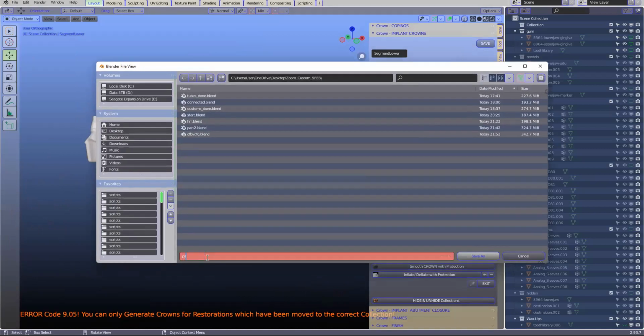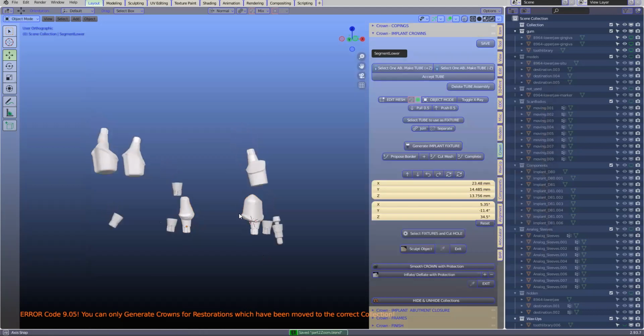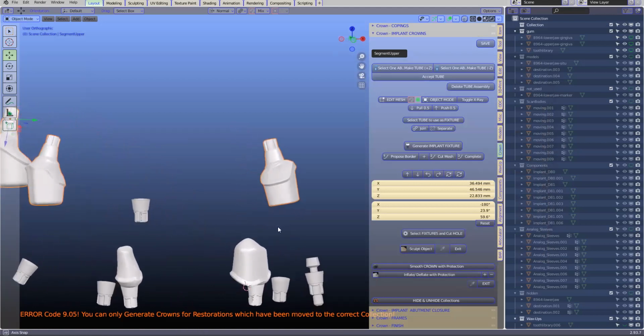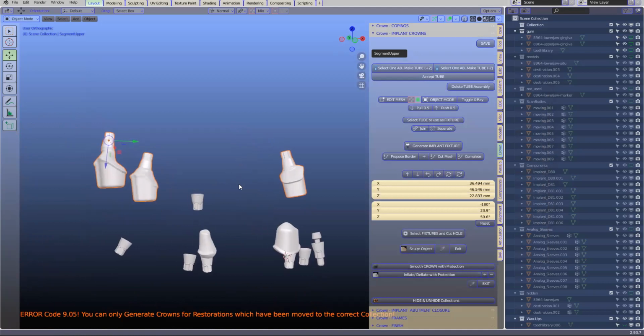So what's your take-home message? My take-home message is that there's a lot of learning to be done, but just keep it simple: hide stuff and do a little bit of object management. You've got an established workflow. You make the tubes, then connect the tooth library on there, then create this yellow or green surface that you point towards yourself, then extrude that into parallel, and then start working on the abutments: put the step in, change the angle, remesh it.